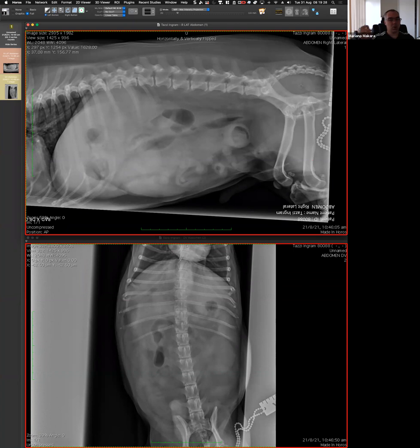Then what about the colon? Is there a lot of feces stuck in there, waiting? Is there constipation? Trying to bring supportive information, trying to bring something that will help me support that hypothesis. So I don't see that.